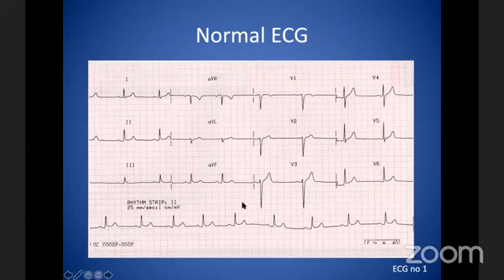Okay, so in this ECG, I'll take you through this one. The speed is correct, voltage is correct. Other thing to remember is patient identity. In clinical practice, always make sure it's the right patient. The name should be on the top. Never ever report an ECG which does not have any label on top.